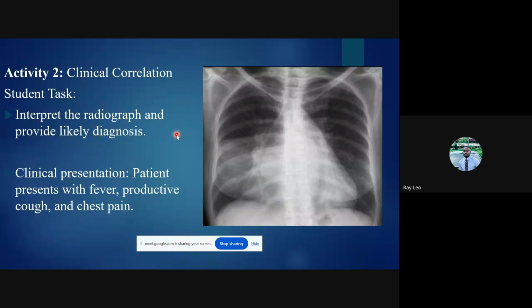I'm thinking it's pneumonia because there is consolidation on the right side, opposite the cardiac silhouette. There is a consolidation, if I'm not mistaken, so I think it's pneumonia. But I'm trying to picture the air bronchogram, and I don't know if what I'm seeing is it, so I will not speak on that.